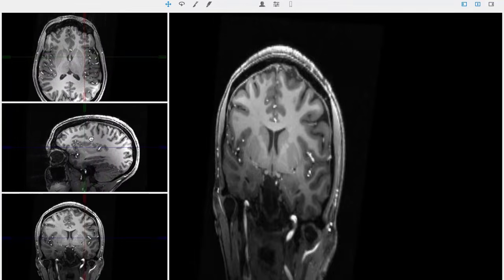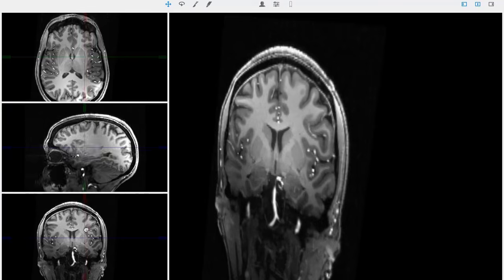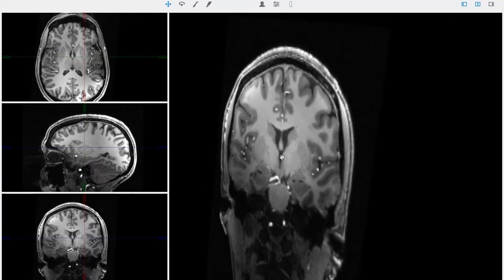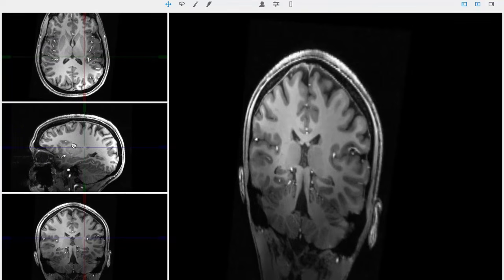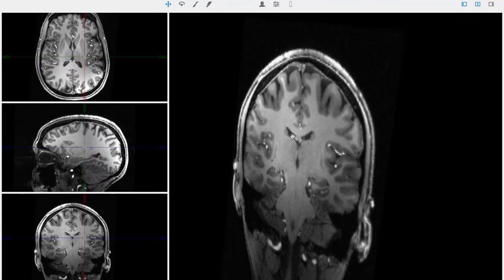Now, when I was learning this, I remember the instructor would always say, okay, here are the ventricles. There's the two lateral ventricles. Here's lateral ventricles here. And then they'd go back farther and they'd say, and if you go back more caudally, you can see the third ventricle. And then if you go back to the cerebellum, you can see the fourth ventricle. And it's always such a mystery to me, how on earth can you see the ventricles in like 1, 2, 3, 4, 5 places? Well, all we have to do is add the ventricles, and here they are.